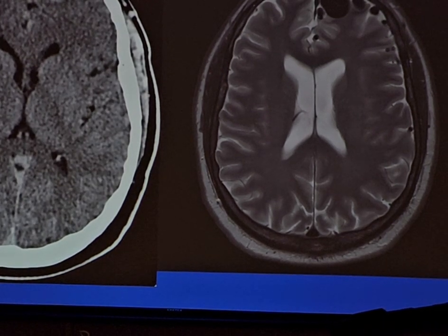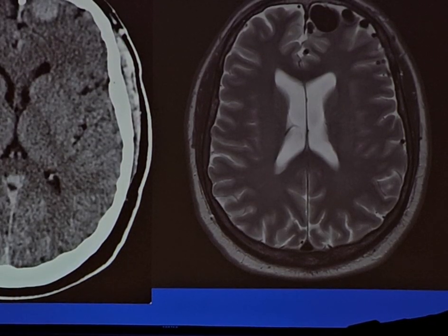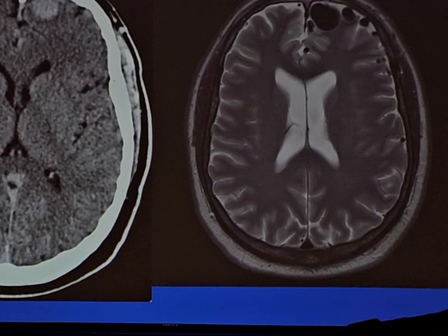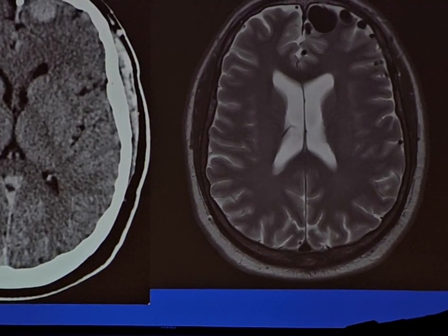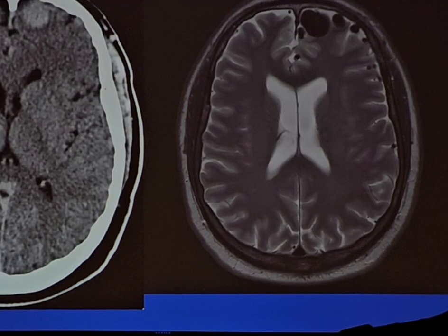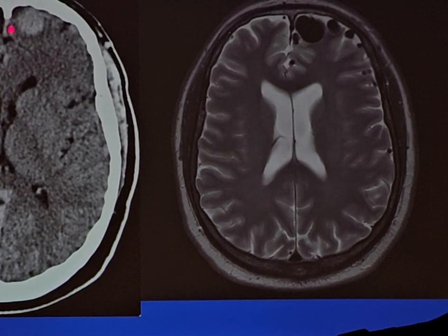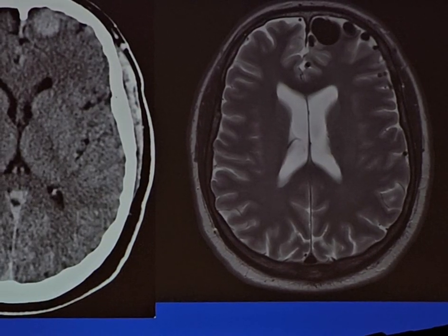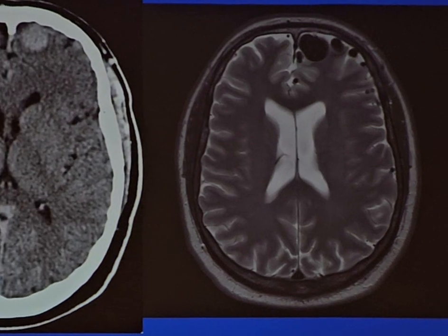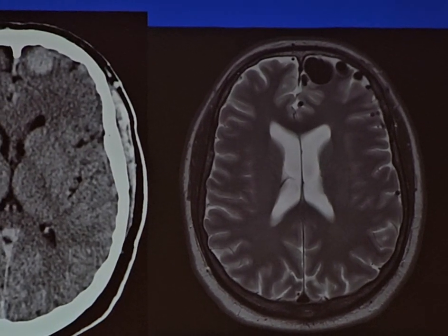This is a classic picture, right? So you can just tell me what it is. Nothing else looks like this. Come on, radiologists. Come on. Yellow bars. Yes, it's an anterior cranial fossa dural fistula. So as soon as you see something right there next to the falx, and it's big and fat, it's not going to be an artery, it must be a vein. And if there's a vein in the anterior cranial fossa, it's going to be an anterior cranial fossa dural fistula.